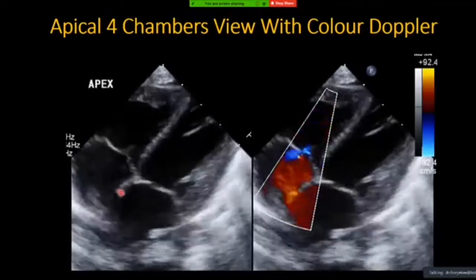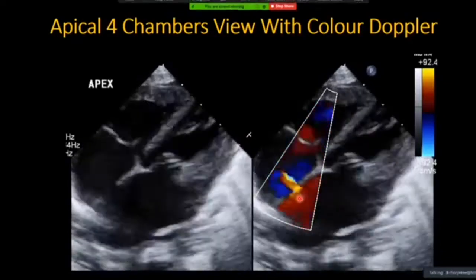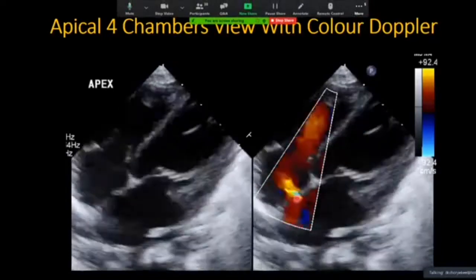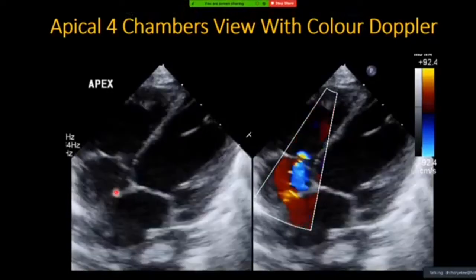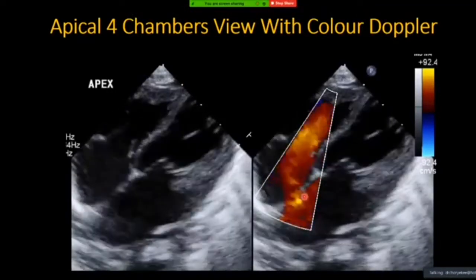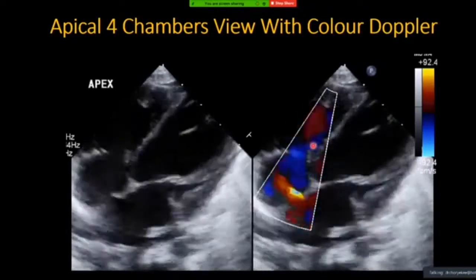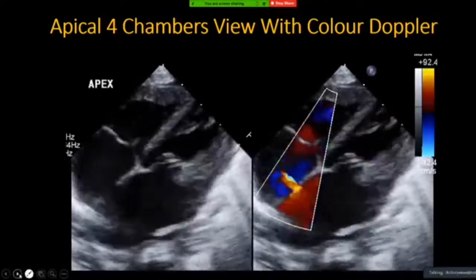So when you look carefully at this septal wall, there is a turbulence across here. You see the turbulence across here. So there is a turbulence across, and there may be some defect there. So actually maybe it's an ASD or a PFO over this side, and yes, you're right, there is also a tricuspid regurgitation.